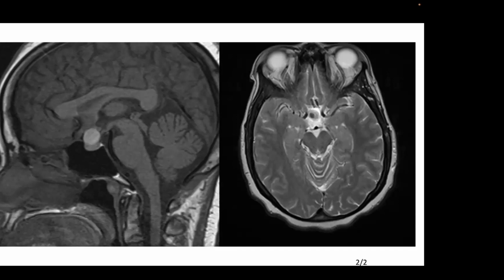Yeah, very good. So I want you all to see this case because what I find is that there's a saying we have here: I'll see it when I believe it. Again, the saying usually is I'll believe it when I see it, right? But what that means is that if you know something is possible, you're more willing to look at things in a different way. So if you know that Rathke's cysts can hemorrhage into the subarachnoid space, then it's easier to make the diagnosis here. But the critical finding here is, of course, this nodule.